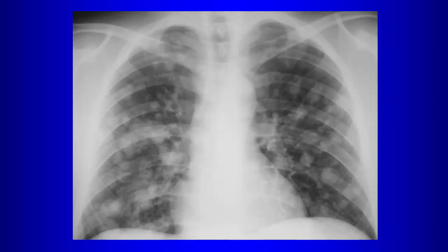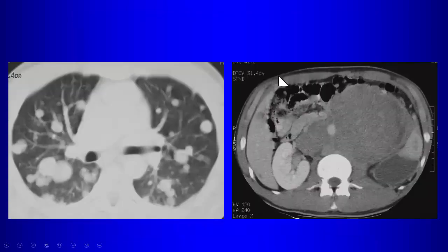Bronchopneumonia? Bronchopneumonia would have more ill-defined borders. Maybe septic emboli. Early septic emboli might, before you get cavitation. Anything else? Fungal infection. Fungal infection can also give you multiple nodules, and with things like histoplasmosis and cryptococcosis, sometimes they can be well circumscribed, okay? But of course, your first thought here is going to be metastatic disease.